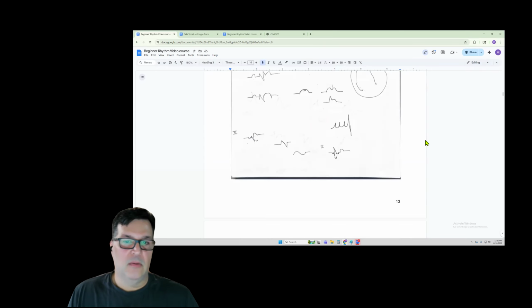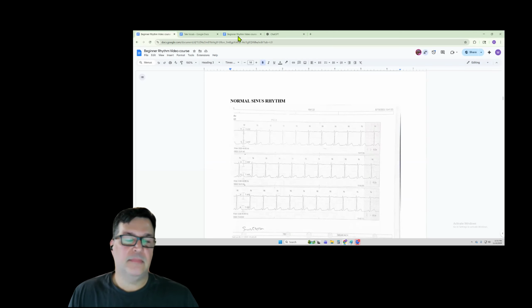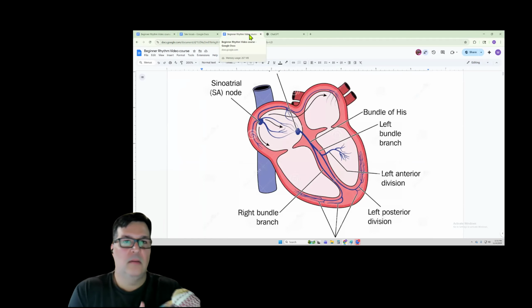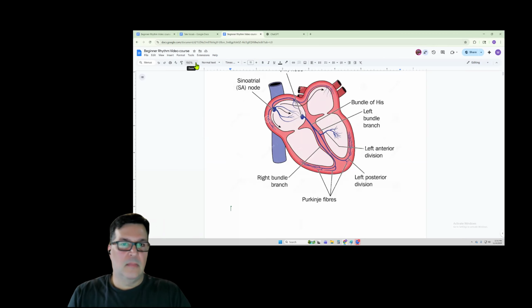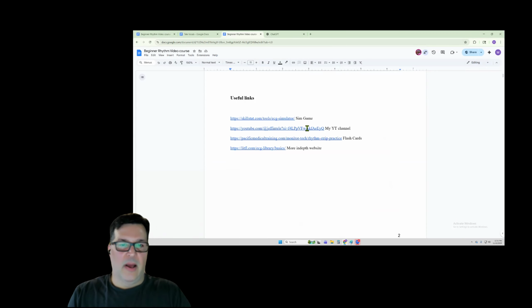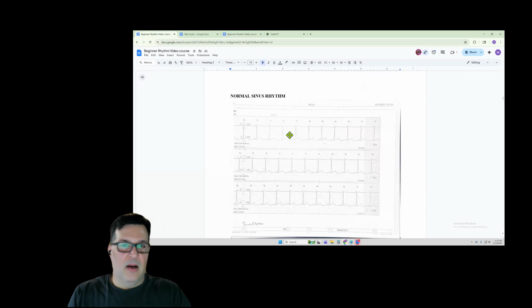All right, so your basic normal rhythms. You are still zoomed in, I think, a little bit on your screen. Is that too much? I don't know. Depends what we're gonna look at. I think a little bit less zoomed in. I can see more of what you're showing. So I had it zoomed in, like, let's look at a strip. Whoops, I'm on the wrong one, sorry.